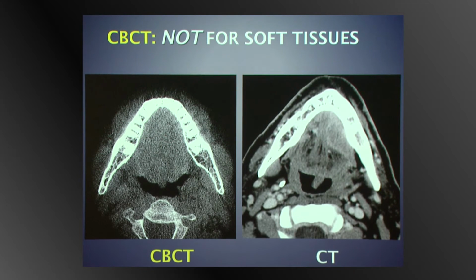There's the same patient with pain in the floor of the mouth, referred from a dentist, mandibular calculus or something, I don't know, and there's a big infiltrating carcinoma. You would think that would be evident clinically, but obviously not in this case.